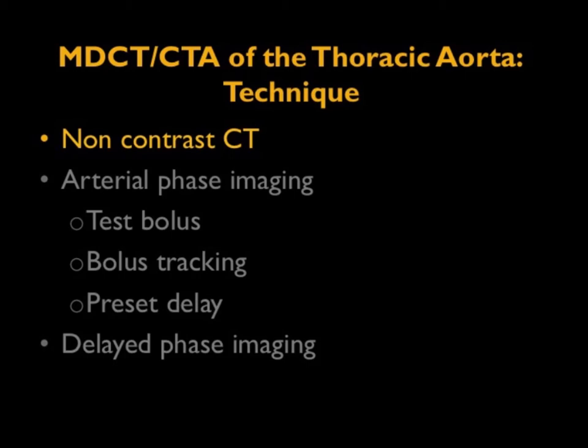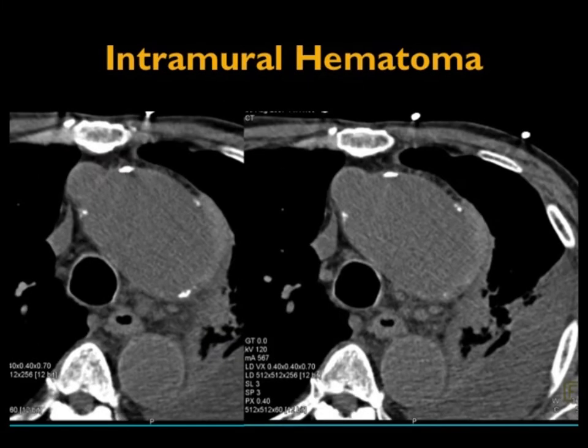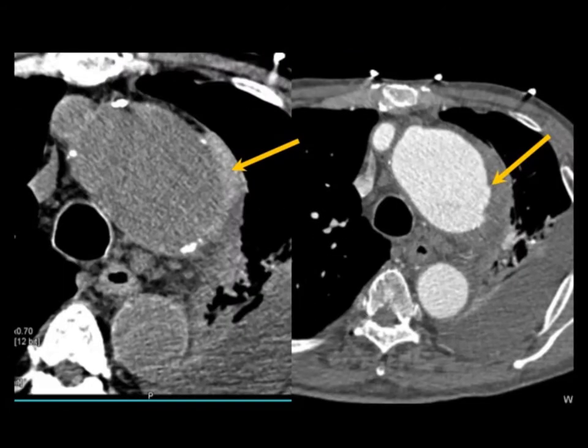An intramural hematoma may be only seen or best seen on the non-contrast CT, as in this example. And you can see the intramural hematoma best when you narrow the window, but once you give contrast, it can be a little bit trickier to see. Look how obvious it is because you're comparing the high-density intramural hematoma to a non-contrast opacified aorta, while on the right, you're comparing it to the aorta, which is opacified.